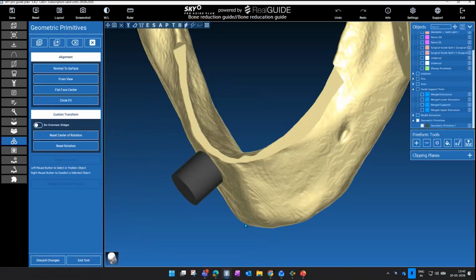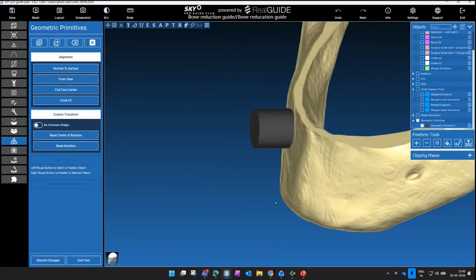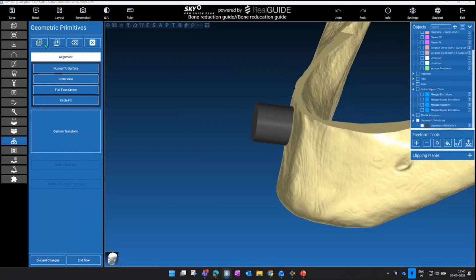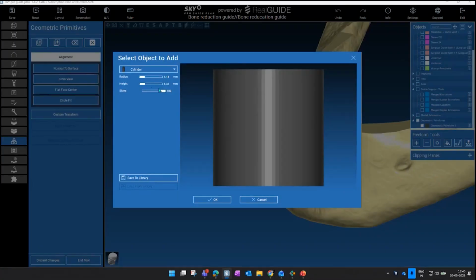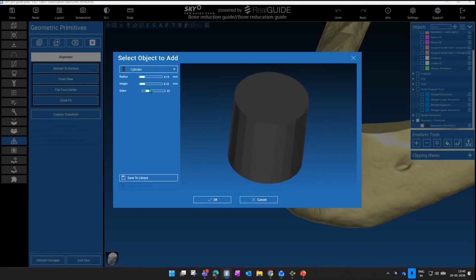So I will give a right click. Now this STL file is created. I want to do something on top of it. So I will go again to add. Maybe I will change a little shape of this. We'll use something like this and then click again.